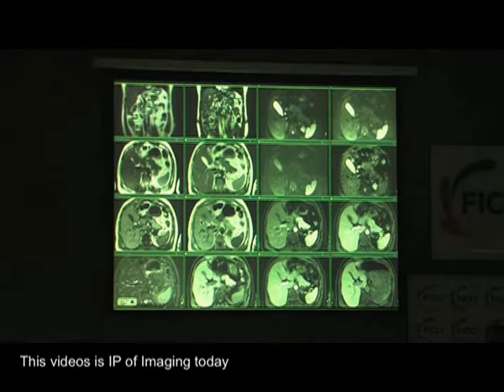You have to have an in and opposed phase in any abdominal imaging. That's pretty standard, and that's going to be the key sequence for you to pick up a lot of the pseudo lesions that I'll talk of. Then you have the lesions with FAT-SAT, the diffusions and the ADCs, and these are the post contrast studies. And this here is the delayed scan, and you can see that the liver parenchyma in the hepatobiliary phase shows a much greater enhancement than the parenchyma in one of the earlier phases.